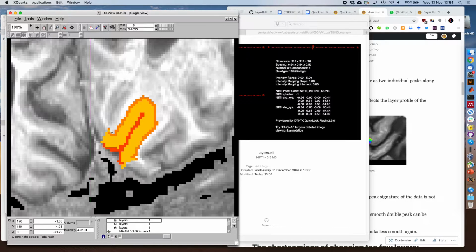It over-amplifies the curvature. So if you have noise, it over-amplifies the noise. And that can be really challenging. You don't need to worry about that with FreeSurfer because it kind of smoothes the cortical ribbon. However, as soon as you smooth and have smooth folding patterns, then you always have some biases for sulci versus gyri. So I chose that algorithm because it works and because it doesn't have this noise problem. Ultimately, I think if you have very, very high resolution, you would want to use the equivolume approach. But you can describe it as a clustering algorithm too, or whatever you like.